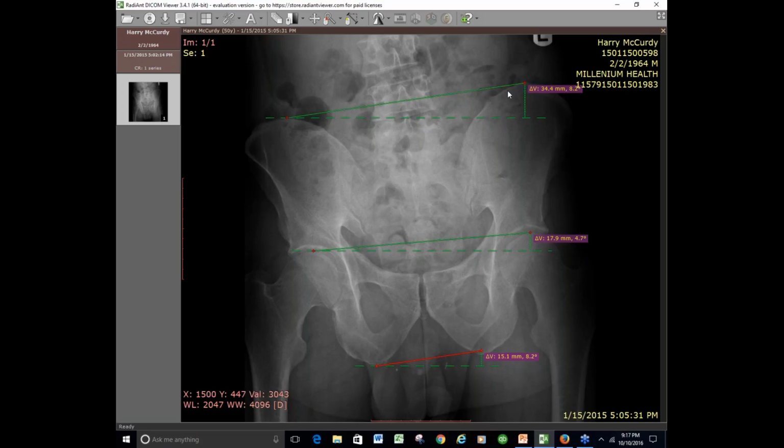So let's say it's 10 and a half and 15, something in there. So I have to subtract 10.8 from 15.1 to figure out how much of a lift I actually have to give this person. So I know that was complex, but if anybody followed that and can figure that out for me, what do you think the answer is?